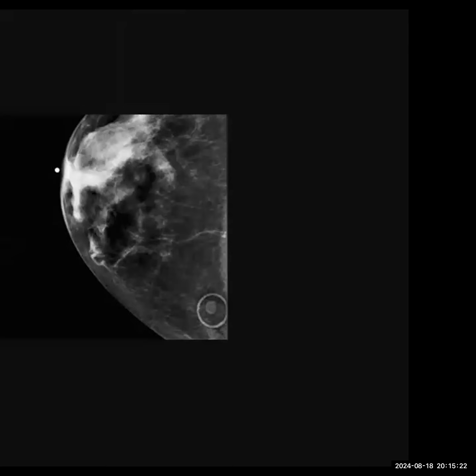You have to identify what has been done in this case, in this mammogram. What is the marker used? And why is that marker used? What is the name of the marker and why is the marker used? Is the marker this one? You can just click. This. Yeah, correct.